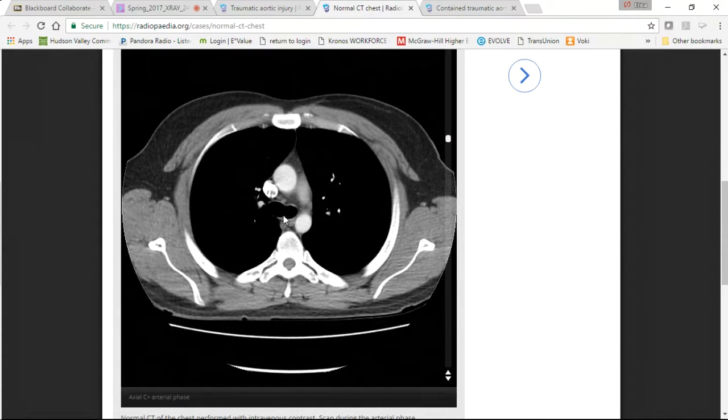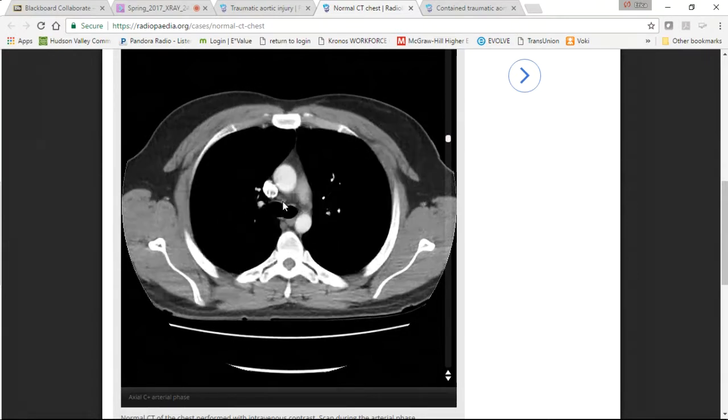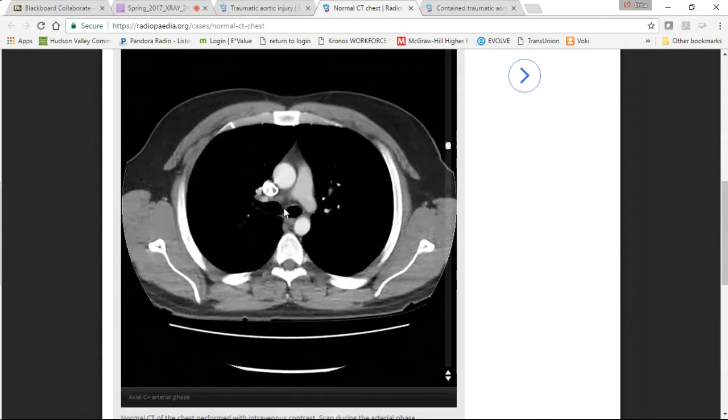And this is otherwise known as the carina, right? And I'll show you that on the coronal view as well. This is a very important landmark. It's very easy to see on most CAT scans, the coronal view. And when you look at the vessels that are surrounding this area, I can distinctly see the carina, and just one slice down from where the trachea branches, I have my main stem pulmonary branch coming out here. This is your main pulmonary artery.